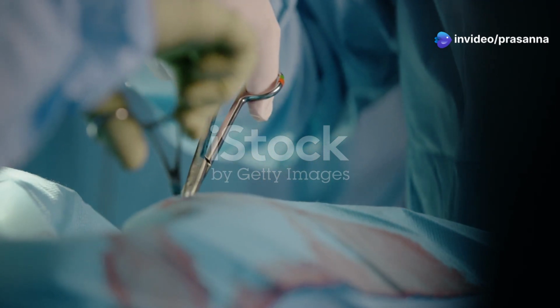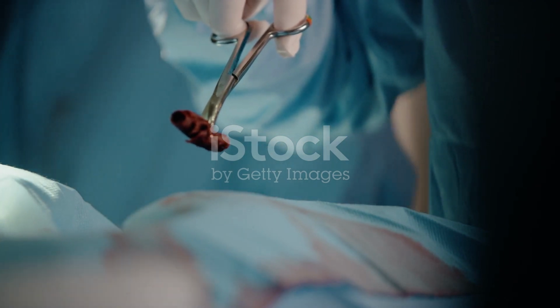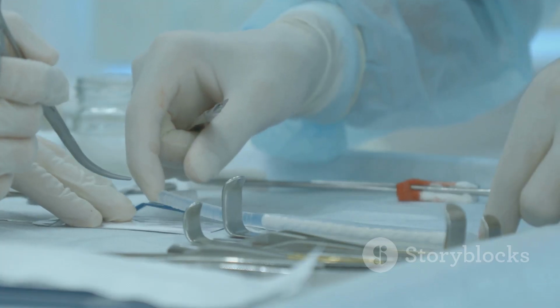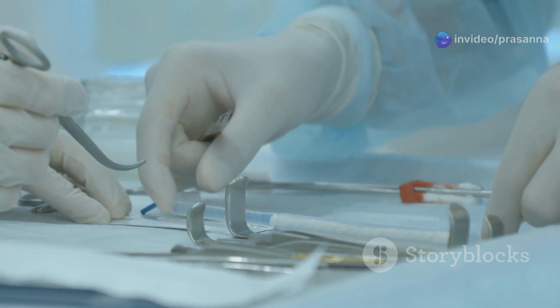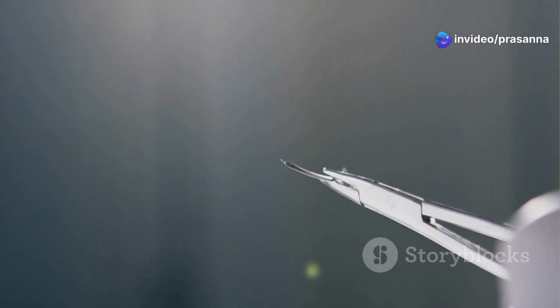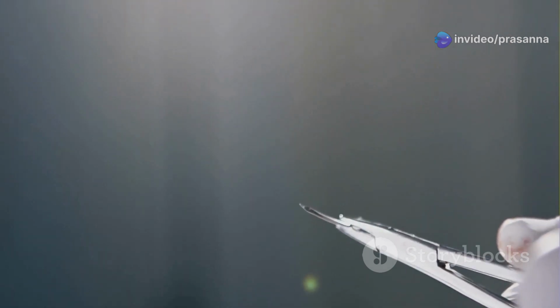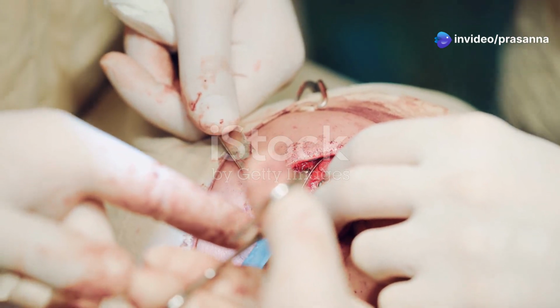Grasping instruments, also known as forceps, are essential for holding and manipulating tissues during surgery. These instruments act as extensions of the surgeon's fingers, providing a firm grip on slippery or delicate tissues. One common type of grasping instrument is the toothed forceps, which have small teeth that interlock to securely hold tissues. These forceps are often used for grasping skin or fascia, providing a secure hold during suturing.